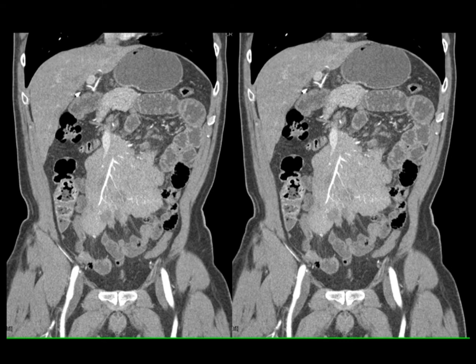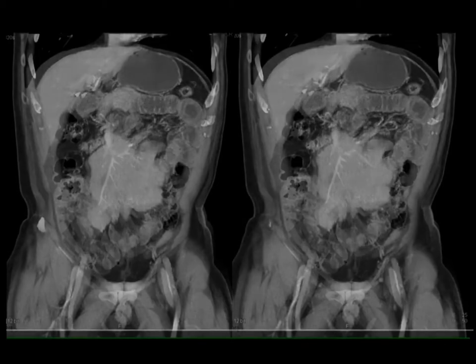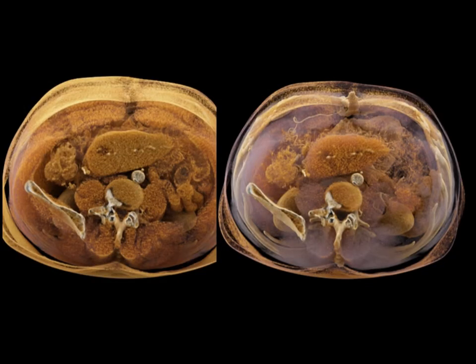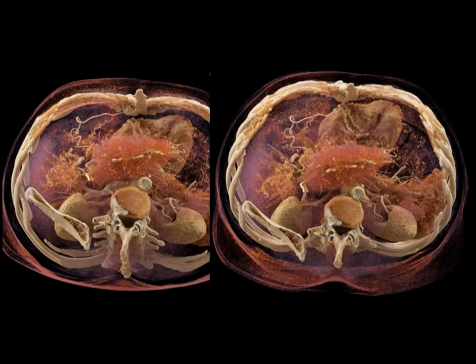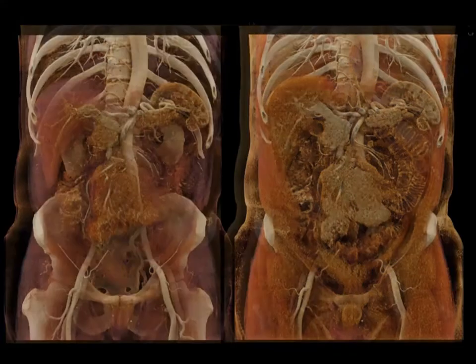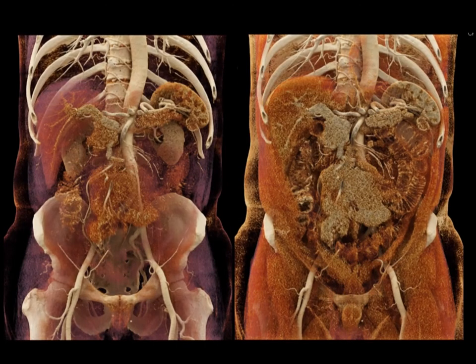This is a soft tissue mass that's infiltrating, shown nicely on the volume rendered views, shown nicely on the cinematic. You see the vessels going through what we used to call the sandwich sign. Just a beautiful visualization. And there it is down into the mesentery. Just extremely impressive detail as to the patient's tumor.